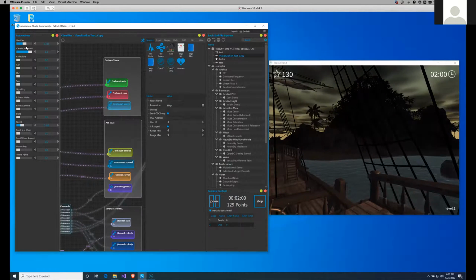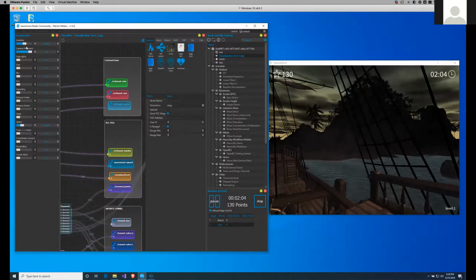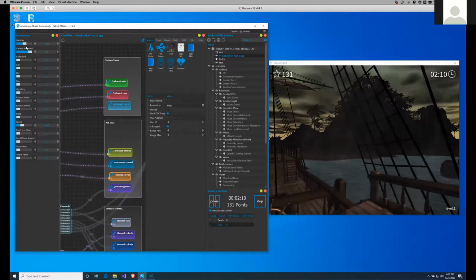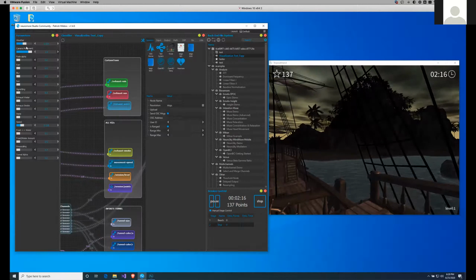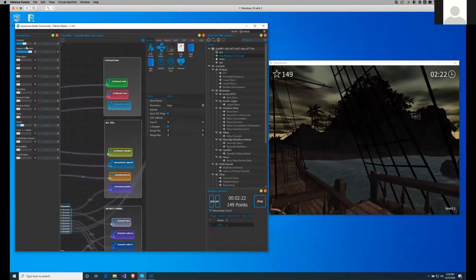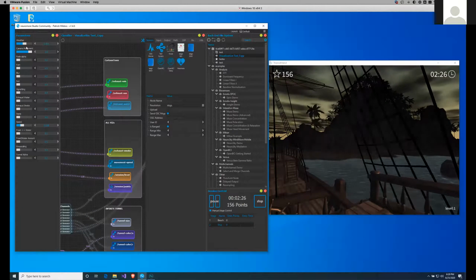And that prefab, once you drag it in, helps the connection to the neuromore studio work out of the box. So you do not have to worry about getting it hooked up, getting OSC set up. Of course, if you want, you can also do it from scratch, but that prefab will get you started pretty quickly. And until we have that prefab available in our open source branch, we are happy to share it with you.